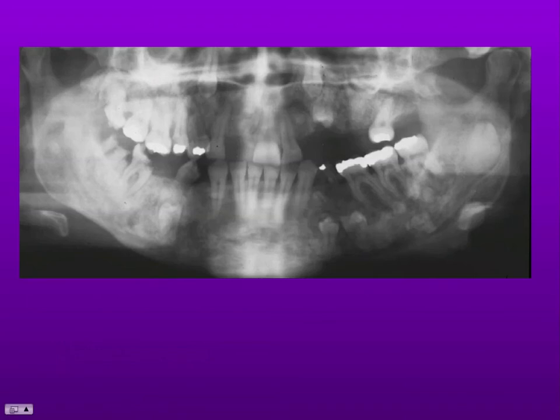This patient attended dental casualty at the hospital complaining of toothache on the lower right. Not surprising considering the condition of these two molars. The dentist took a panoramic radiograph, but strangely, after the teeth were extracted, simply discharged the patient. I hope you wouldn't have done that, because we've got a lot of very odd findings here. We have several unerupted teeth. We also have multiple radiopacities. There's a strange one overlying the ramus here. We have odd patchy areas of radiopacity in the jaws.